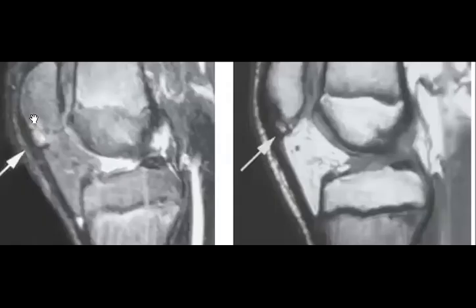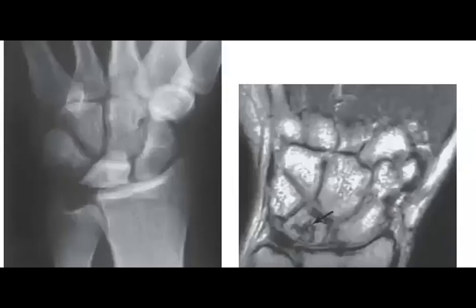Again, another appearance of this affection of the patellar tendon at the insertion of the inferior patellar pole. And you can see already in the image that this patient has unfused epiphysis, so he is in the adolescent age. That means that it could be the typical history of jumper's knee if you ask him. This one I think is very easy, and you should recognize it as a typical case for the exam.